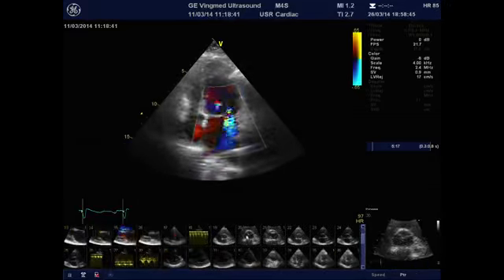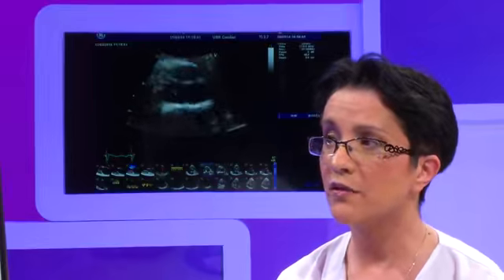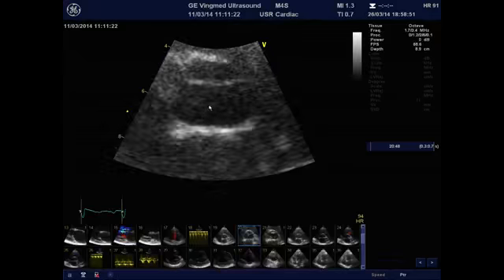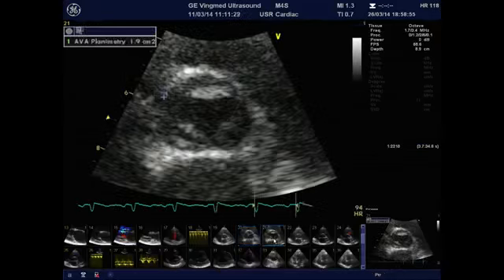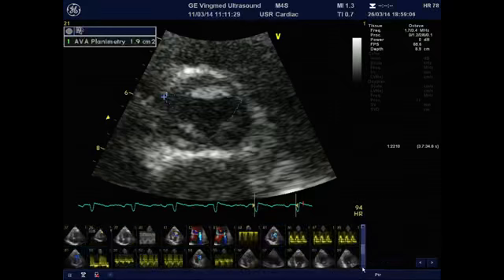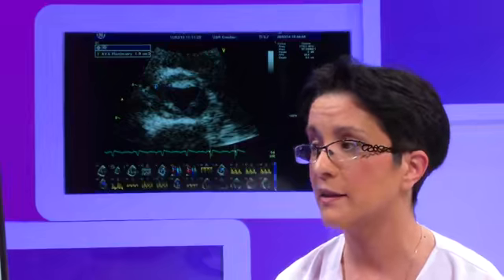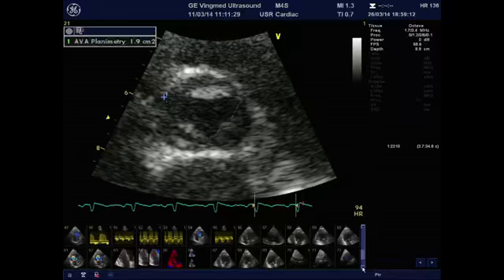Moreover, there was an association of discrete thickening of the free margins of the aortic valves, which are tricuspid, leading to a degree of mild aortic stenosis by planimetry and also by continuity equation being around 1.9 centimeters square, which shows us that this patient has the involvement of 2 of her left heart valves.